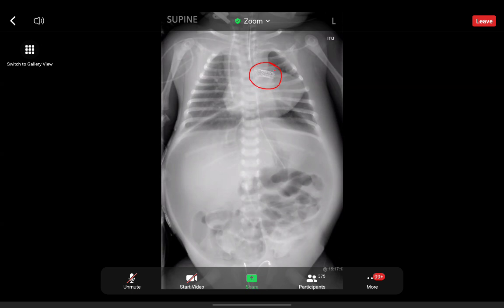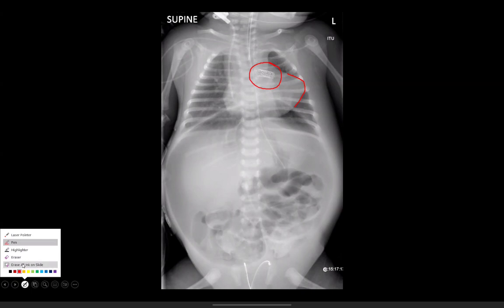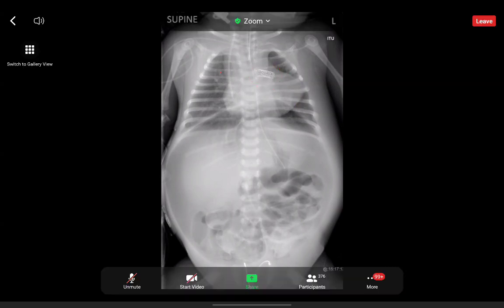What you should hopefully see here is they've had cardiac surgery. You'll notice the cardiac apex is also elevated and the heart looks rather boot-shaped. So I can see some people again saying tetralogy of Fallot. Yes, exactly. So this child has tetralogy of Fallot, and post-operatively they've got necrotizing enterocolitis and a perforation. You can't see it amazingly well, but let me clear all my ink again. There is also a hemivertebra here. So this child also has VACTERL as well. So plenty to find on this film, and it is a good exam case.